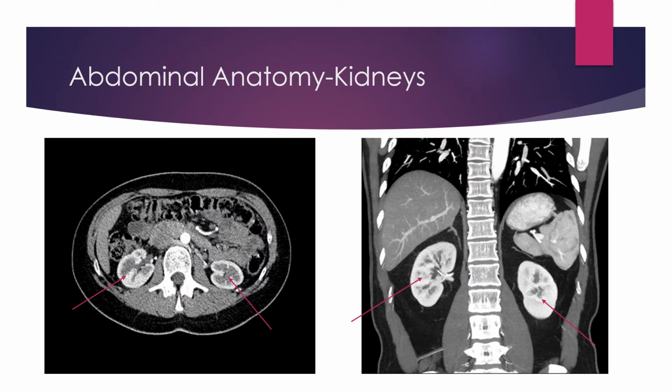Both of these images are pointing out the left and right kidneys, and because of the liver sitting on the right side of the body, the left kidney sits up a little bit higher than the right.